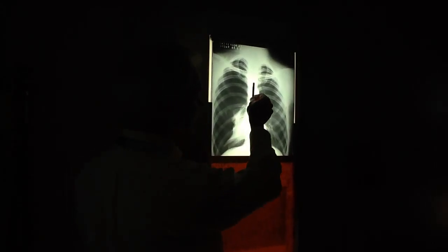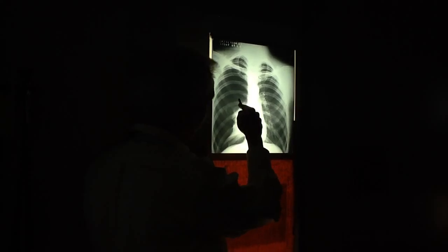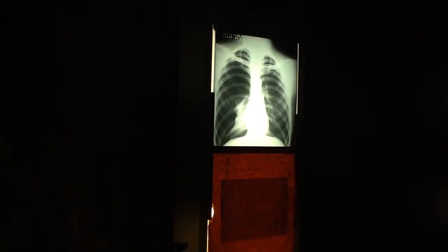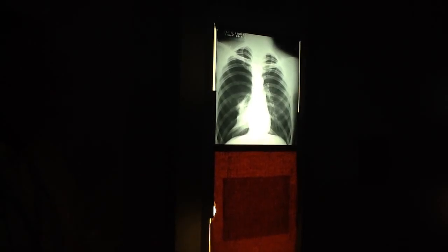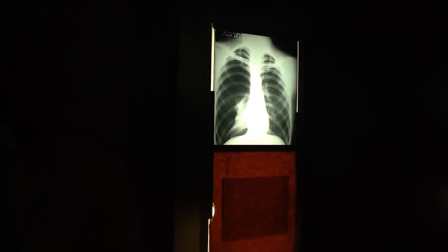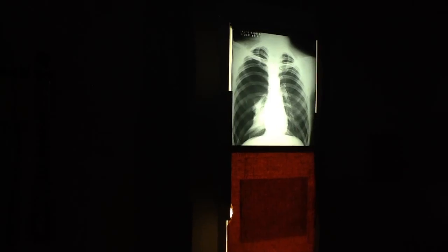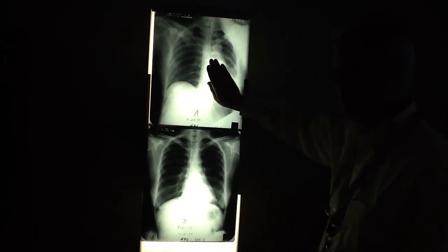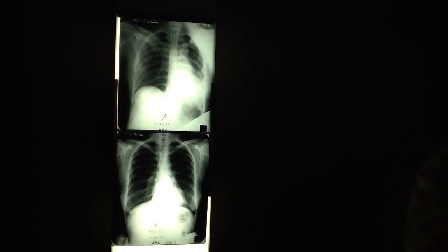Notice the mediastinum didn't move. Now, we have a major collapsed lung, but the mediastinum didn't move. Why not? How come the mediastinum didn't move? The mediastinum moved over here. Look where the heart went. Because this is the same individual. Look at where it went. From there to somewhere over here, and the whole mediastinum's moving. How come it didn't move over here?